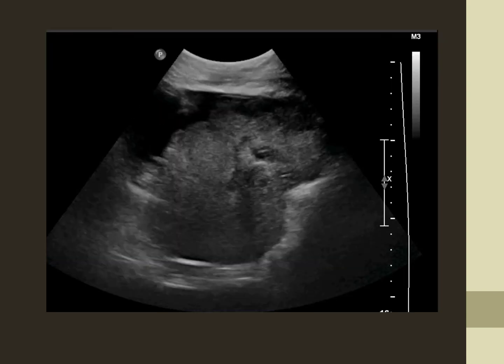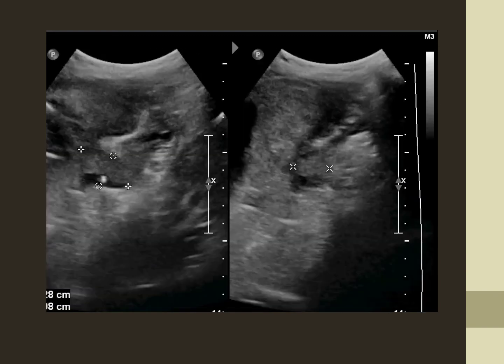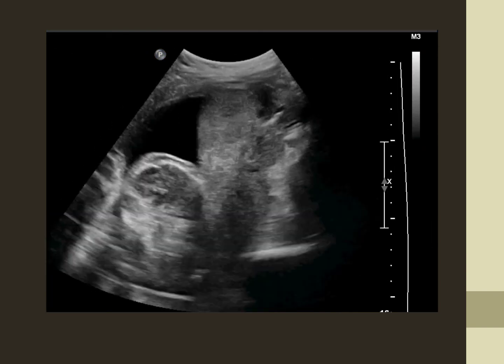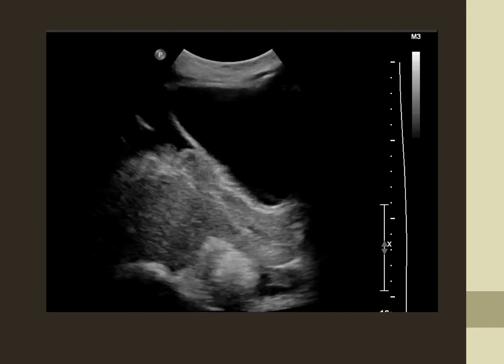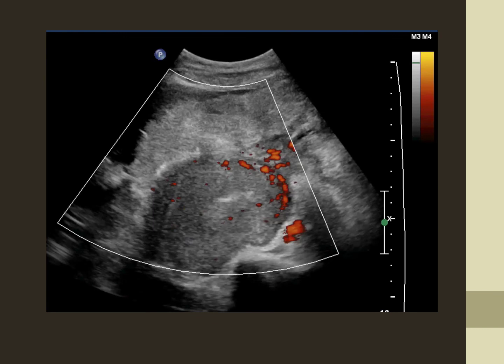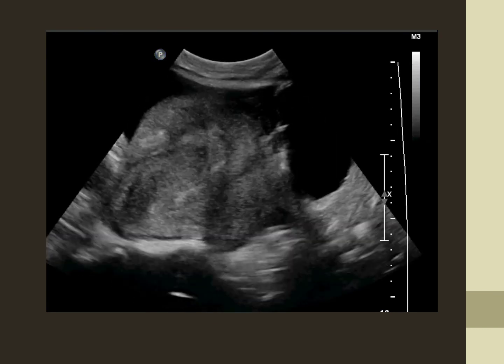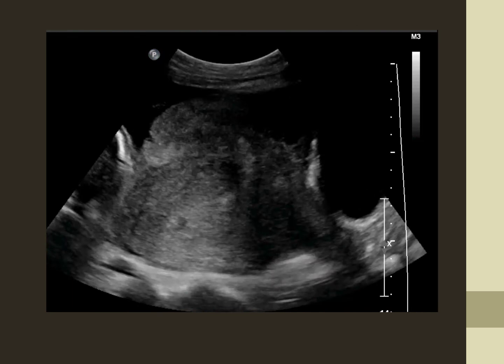This is a patient who was undergoing mid-trimester termination of pregnancy when she developed abdominal pain. The ultrasound showed that the fetus was lying outside of the uterus, and there was no cardiac pulsation, indicating that it was non-viable. There was suspicion of uterine rupture.